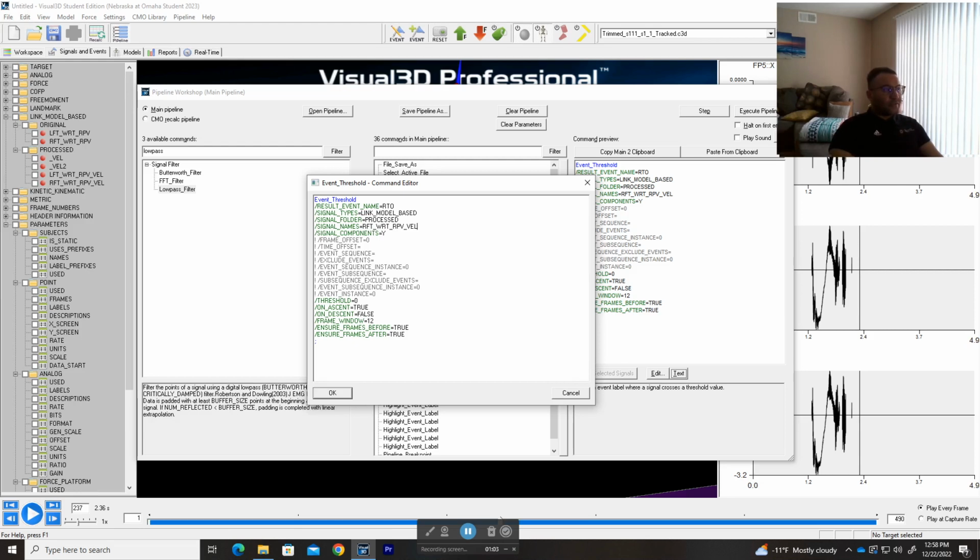Okay, you can either create it yourself, or you can just use the one that Visual 3D created. But if you do that, you need to make sure that the signs are correct, because Visual 3D creates those based on the coordinates of the lab. So if the person is walking north or walking south, it's gonna be different based on the direction they're walking. So make sure all the time, again, I can't really stress this enough, you have to always go back and recheck your data and make sure that everything's making sense.